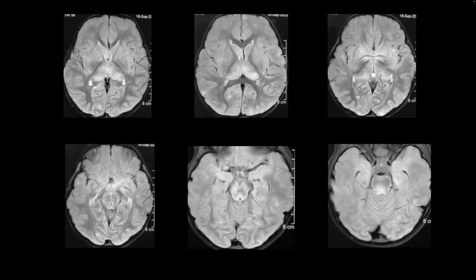Okay, so I have non-contrast sequences, and you can appreciate that there is predominant deep brain nuclear involvement, the basal ganglia, the anterior and mid segments, and also the bilateral thalami, demonstrating these edematous changes. Coming down, the peritrigonal white matter also has some T2 hyperintensities. The brainstem also demonstrates these hyperintense changes. The medial temporal lobes also are slightly hyperintense. Again, the dorsal brainstem is hyperintense. The vermis shows some hyperintensities.